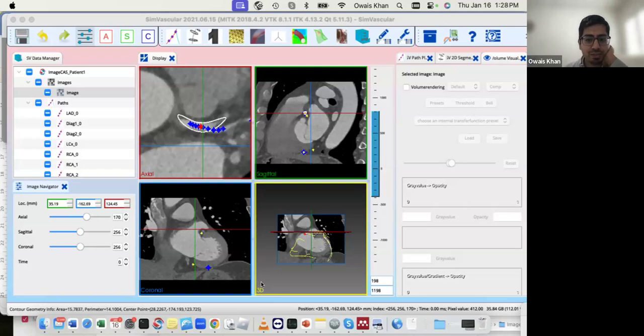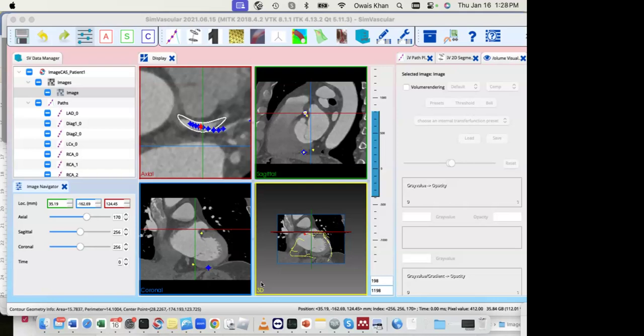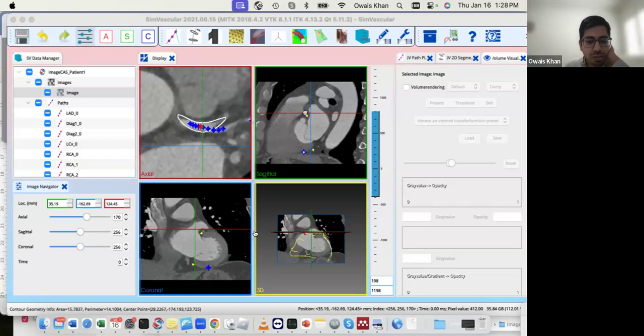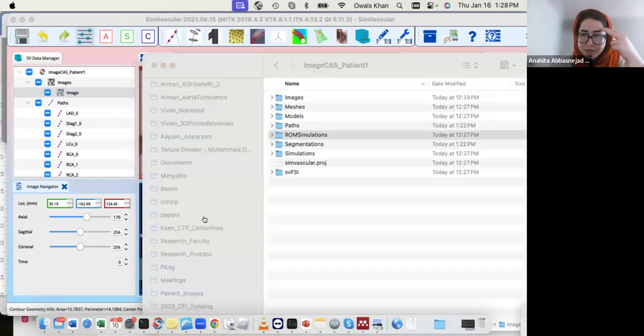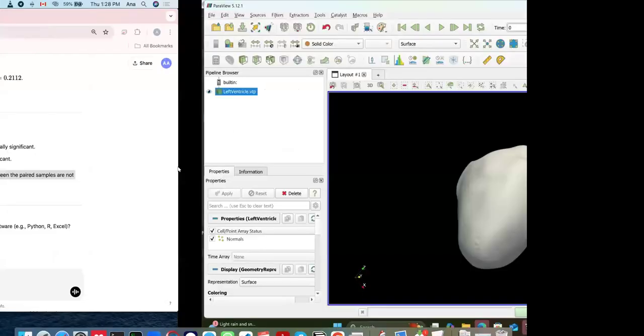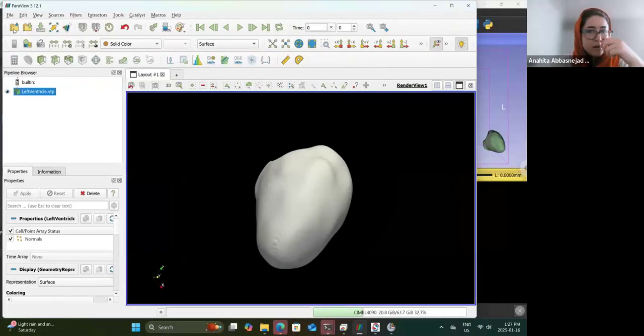Do you have any kind of good reference diagram that we could compare to? Because it could be helpful just to visualize the heart. I can show you something, Dr. Fan, if that's okay. Yeah, Anna, do you have something? I can show you a case. So by reference diagram, you mean the anatomy of the vessel, right? The anatomy of the coronary trees. Yeah. Okay, let me just open this case.